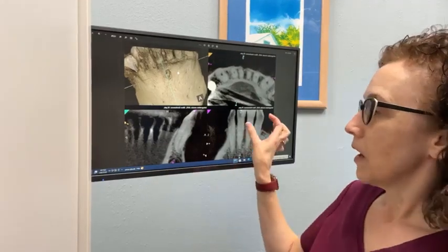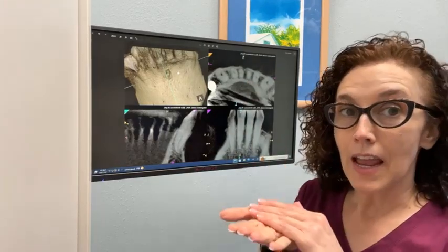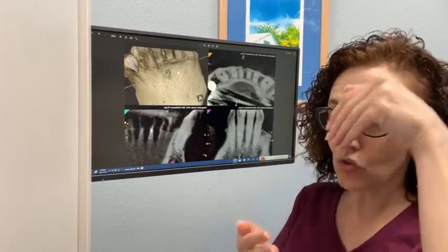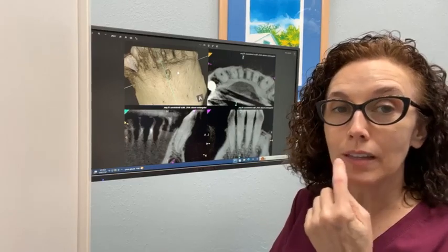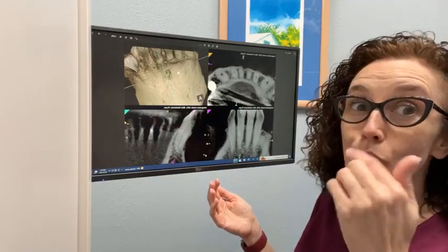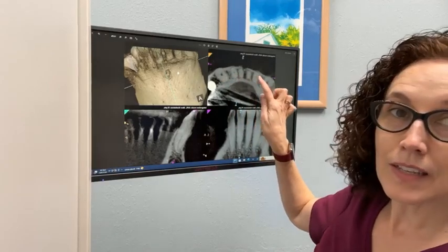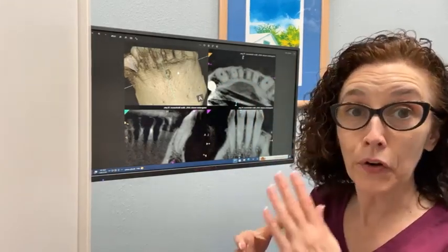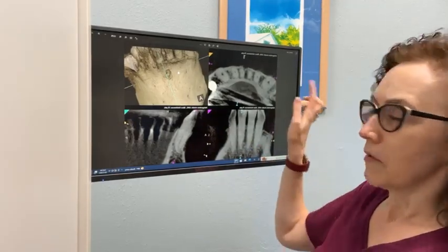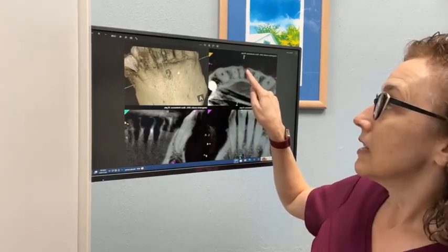So for example, this is 1 dimension and a 2nd dimension. This is in an x-ray form, like you were looking straight down on the teeth, but not looking at the very top of them, but looking at about 2/3 of the way down. So you can see the little holes in the teeth, which are actually where the nerve of the tooth is, in the dead center of the tooth. But you can see here on these lower front teeth, this indentation right there.